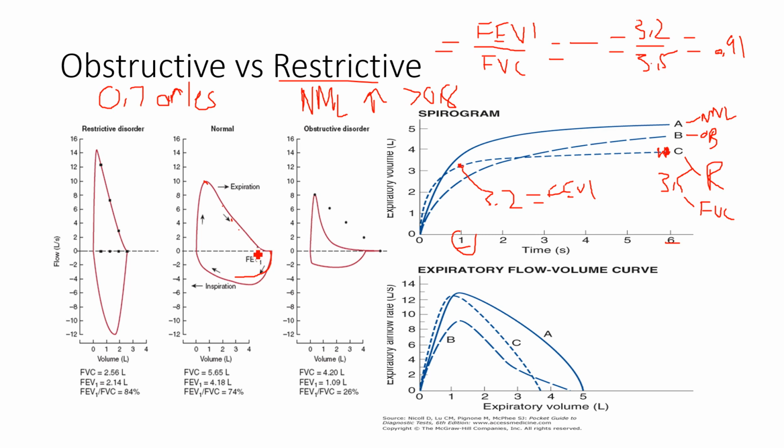Now, in this example here, we can look at obstructive defects. So peak expiratory flow, and then they get out a lot less. They have a peak here and then a huge reduction in flow rate, what we call expiratory scooping. So their big issue is they just don't have enough velocity. The other thing we can compare, which is very similar to our volume time curve, is they still get back.